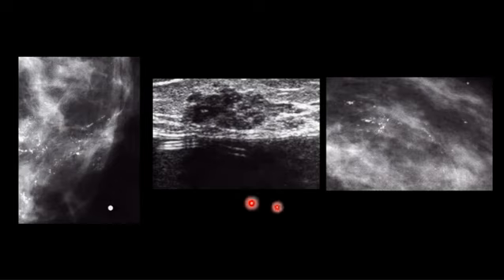So if you see this type of calcification, and this ultrasonographic finding of a mass, irregular, heterogeneous, macrolobulated, what kind of BI-RADS do you give the patient? What degree? 4 or even 5? 4, 5, something in between. Okay? Why? Because these calcifications are regional. They are in a palpable mass, as we said previously.